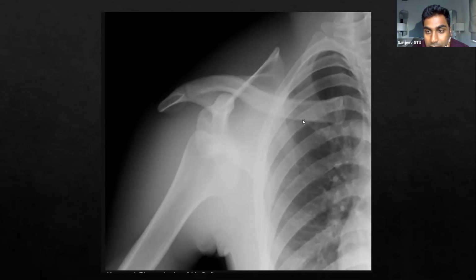Good, fantastic. Fantastic, yeah, absolutely. This is a shoulder dislocation, more specifically an anterior dislocation, which is the more common of the two. So it would be mean for them to give you a posterior dislocation because they are harder to spot, but as long as you've imprinted this image. So this is the glenoid, where the glenohumeral joint should be. What you should have is the humerus nicely up against this little glenoid here, but it's all the way down here. Fantastic.